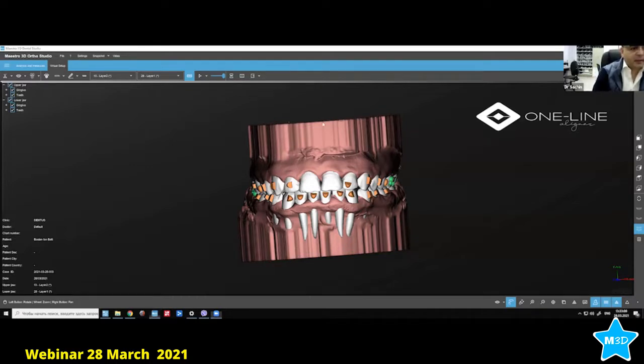So I've never used aligners. How do we apply that on the teeth? Yeah, I'll just show it to you. How do we put attachments on the teeth? So we'll go to this virtual setup.